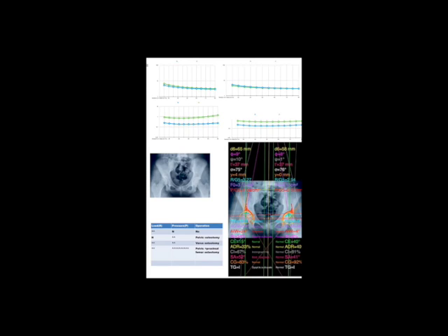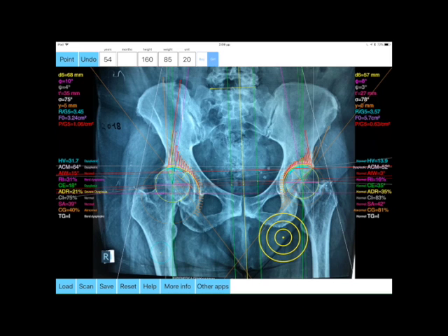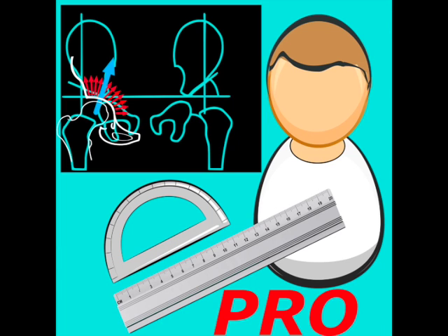The app converts a standard pelvic X-ray from a simple image into an accurate biomechanical analysis study, involving a calculation of the joint load and pressure. In clinical settings, easy assessments of hip load and pressure may help planning operations, modify or monitor treatment strategies objectively, in an effort to improve hip biomechanics.